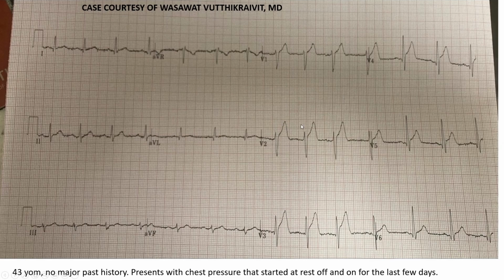So here, look at the STT in those two leads. It's almost bigger than the QRS. That's very concerning. Another thing is when you have pericarditis or early repolarization, you tend to have a big QRS, particularly in early repolarization. You do have a big QRS in those cases.